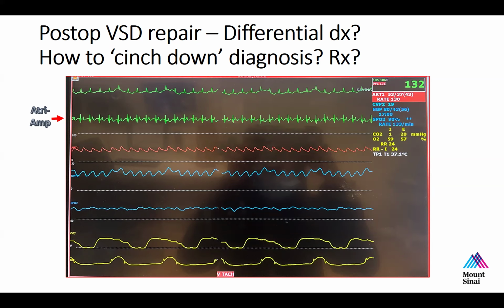Okay, so we now have a 12 lead ECG. Let's say that this patient, for sake of conversation, is 3 months old. So we have an ECG that shows that this QRS is definitely different than the QRS when the patient first arrived 3 hours earlier. It is definitely a ventricular. You've paced the atrium at 140, and you've demonstrated that you can narrow the QRS when you're going down the AV node, suggesting again that this is possibly ventricular tachycardia. So you're pretty sure you have VT.